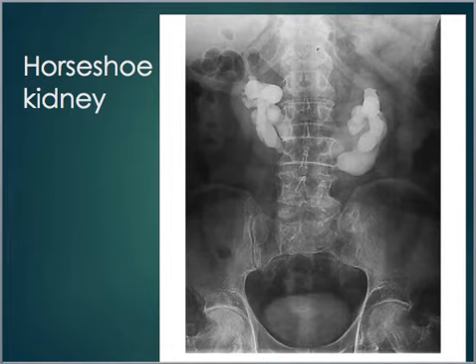This is what it looks like on the x-ray. It's not as easy to see, but you can kind of see here how they form together with the contrast. So you'll see those every once in a while.